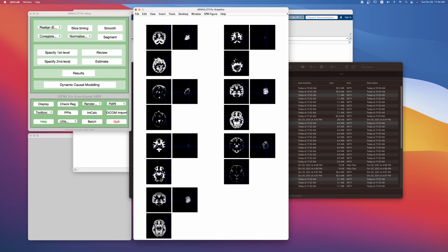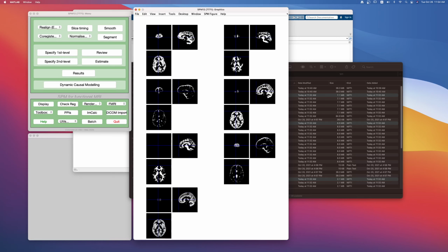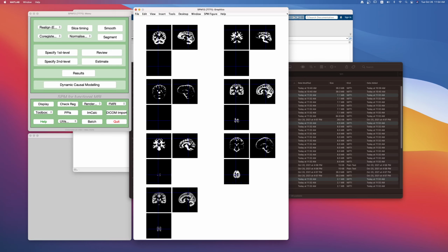It's the same subject, but what's happened here is because it's the W image, it's been normalized. If you click around and you do the same thing as we did, if we check the borders, the front, the back, you'll see that the front kind of matches, but it doesn't match the original, right? And if you move it here, it looks like it's been shifted back a little bit from the original, right? You can go ahead and check. And also you can see it's kind of rotated too, and it's been expanded, all right?